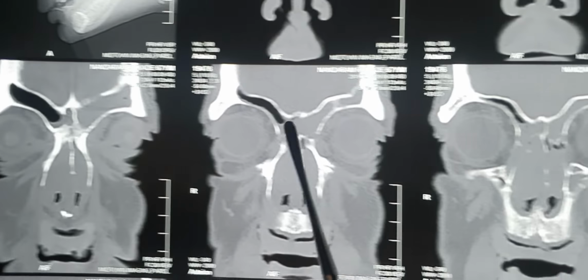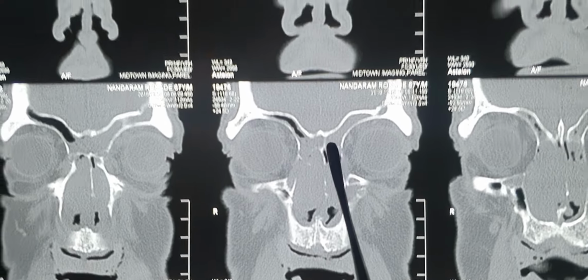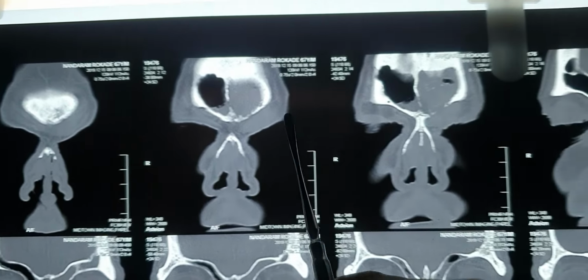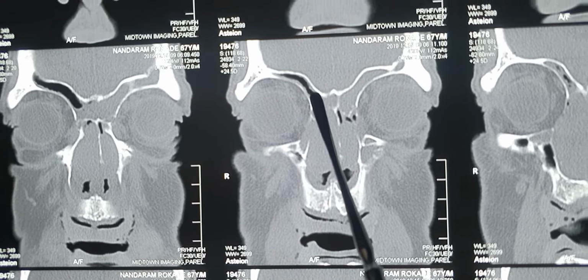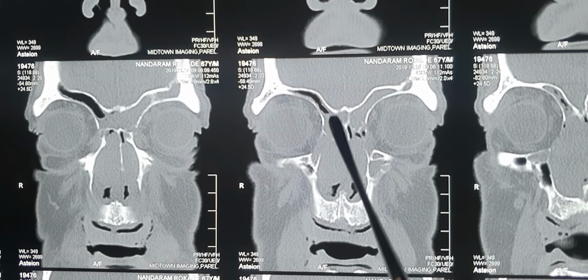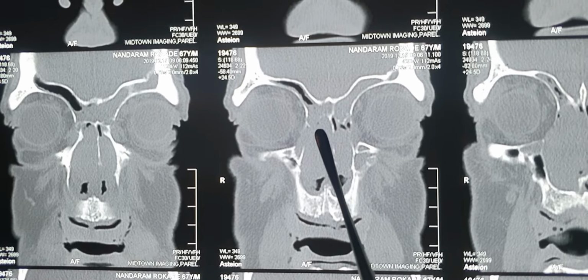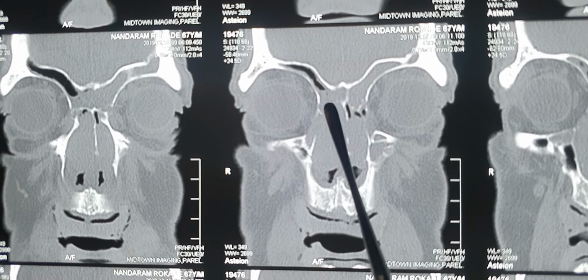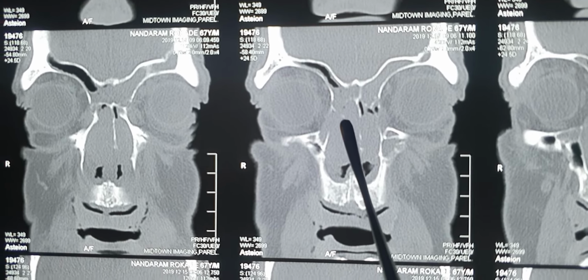So frontal sinus, beak still intact, and in this scan the frontal recess starts. So see, anteriorly is the entire structure of the frontal sinus, and as we go posteriorly the frontal sinus drains into the frontal recess. Now this was the area of relation of the frontal sinus with the frontal recess. The moment the floor is gone, starts the area of the frontal recess.